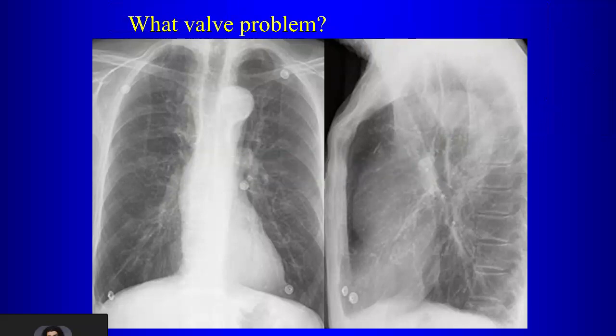The aorta is slightly tortuous. Okay, so especially what part of the aorta? So you see the ascending aorta here, right? So it's a little bit curved. Do you see it on the lateral view? It's this guy right here. Right? So we have a dilated ascending aorta. Okay. The heart size, normal or abnormal? Normal, right. So the heart size is normal, dilated ascending aorta.